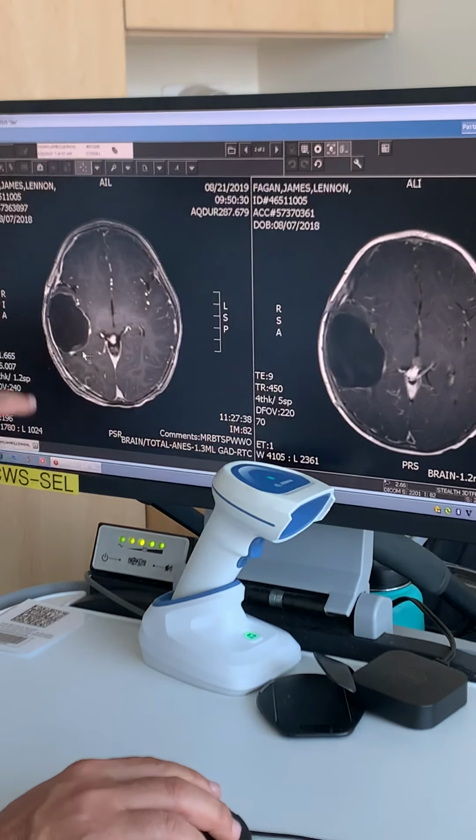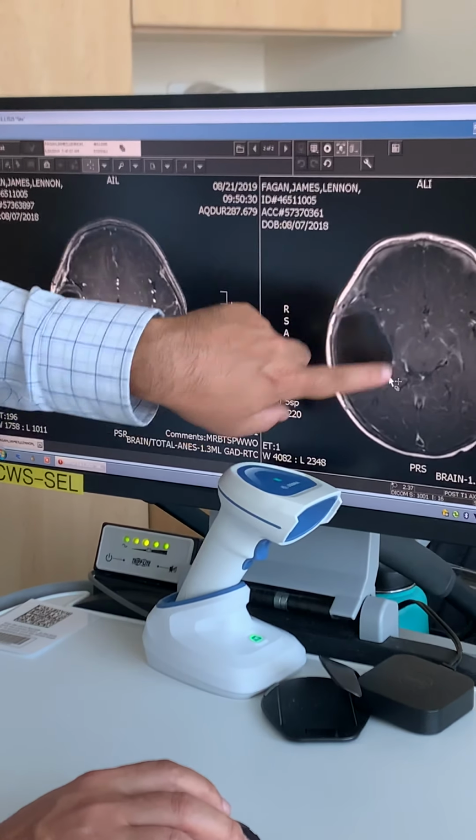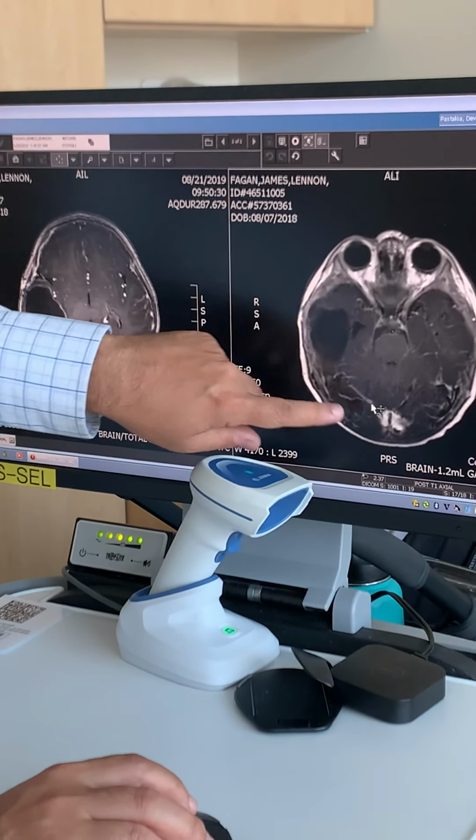So this is where his tumor used to be. And there's almost like a border on that, and that is just them cutting, right? They've taken it out and done all of that, and looking at all of that.